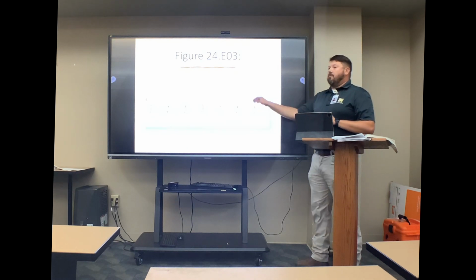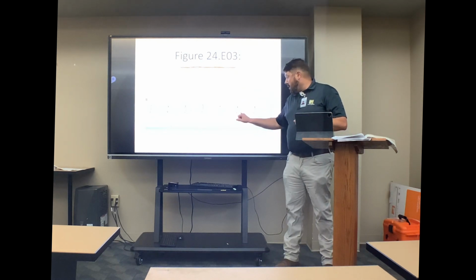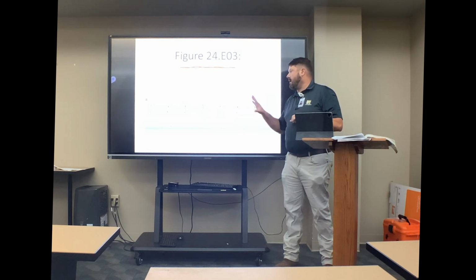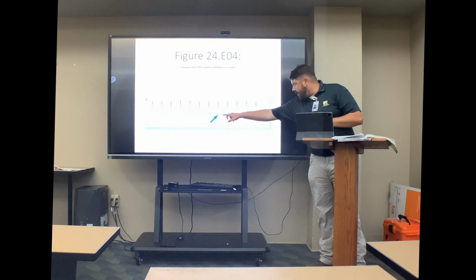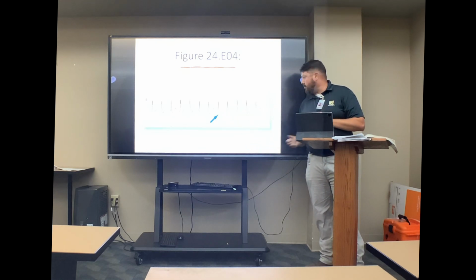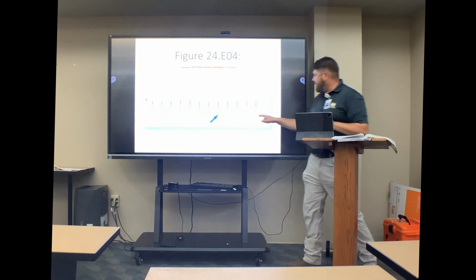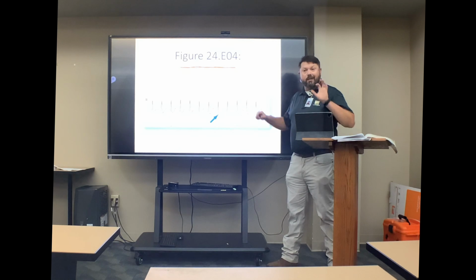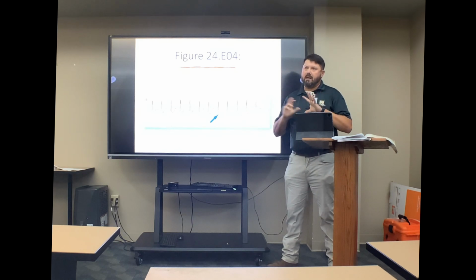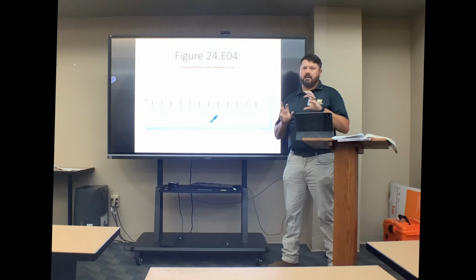This patient had pre-existing issues. So this is kind of an unfair rhythm for y'all because I could see where y'all are like, oh, well, that might be, but they had pre-existing bundle branch issues, and so that's why you've got this widened and looking like this. But that's not a pseudo S wave. That's just a deep S wave, slurred S wave. Whereas here I can see how that could be a little bit confusing. But you got kind of a notch here versus this is just a smooth transition. It's the little things that sometimes make identification a little bit tough.